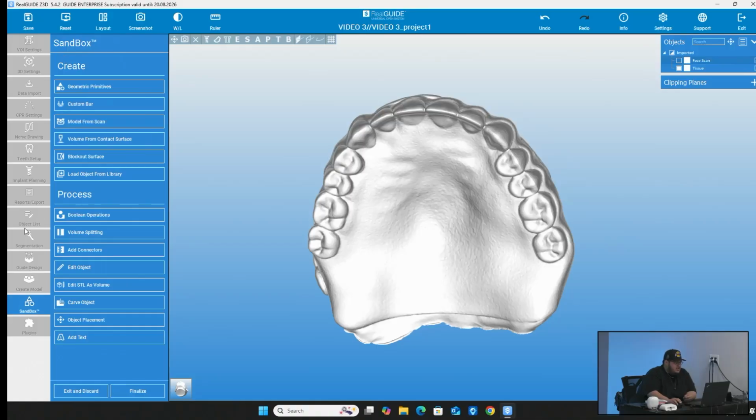It's still going to be the same thing, but just so you can differentiate what scan is what and what you're going to use them for, we're definitely going to go ahead and just use the tissue scan, or the one we have labeled as tissue scan. It will become our tissue scan right now.